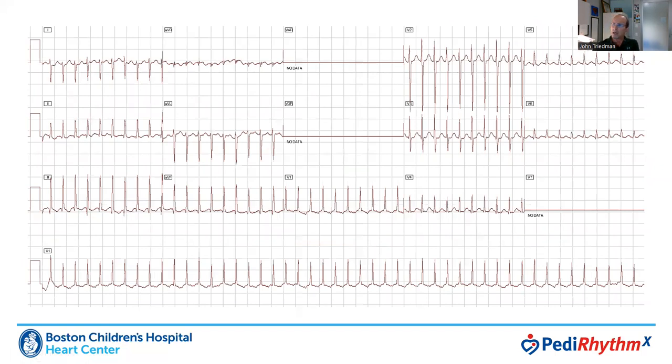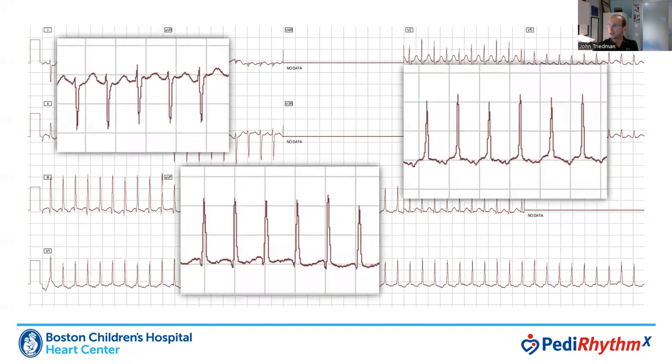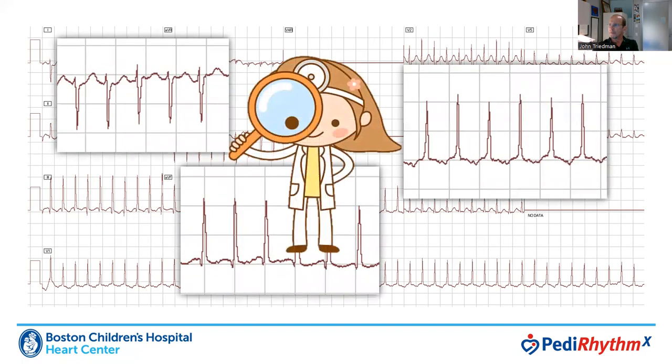And a lot of the time, we just can't exactly tell. So here's another electrocardiogram. I'll give you a tip and tell you off the top that this is actually an electrocardiogram of someone who's in AV-NRT. But if we look closely, one could argue, if you take a microscope, and I'll encourage you generally not to do that, but if you take a microscope and begin examining the T waves closely, you might convince yourself that there are some P waves buried in there.